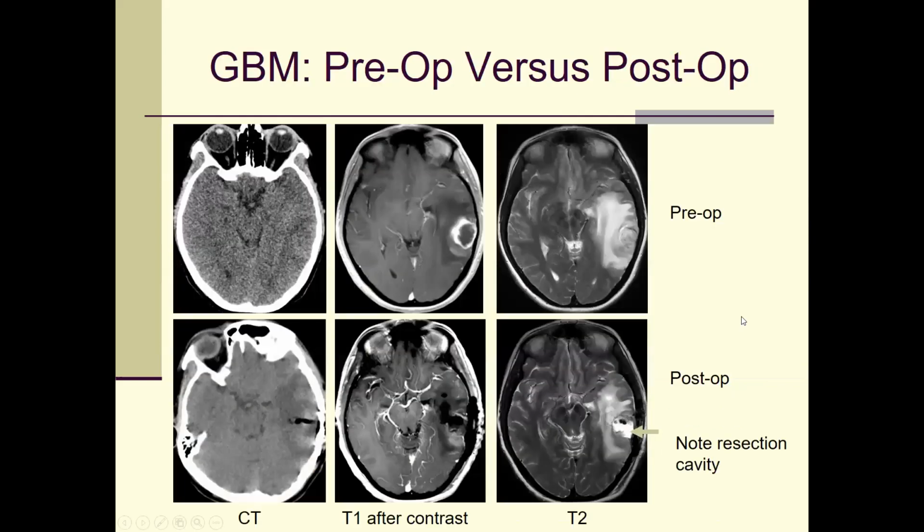So we use all these multimodality assessments in the pre-surgical stage, and then you do a surgery. So this is a pre-surgical imaging, and then we were able to detect this tumor, and then I'm able to assess the amount of the edema. There's nothing else on the other hemisphere, but medial to this, there are just some small areas of abnormalities. And so this is a post-surgical scan.